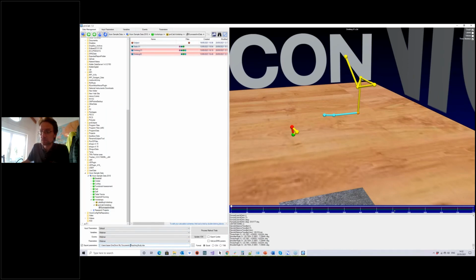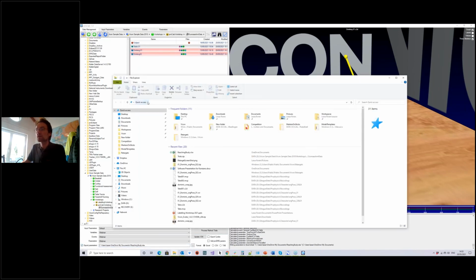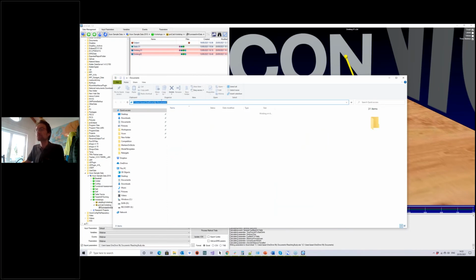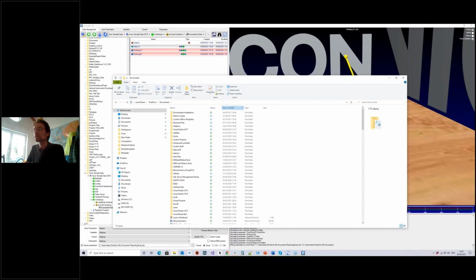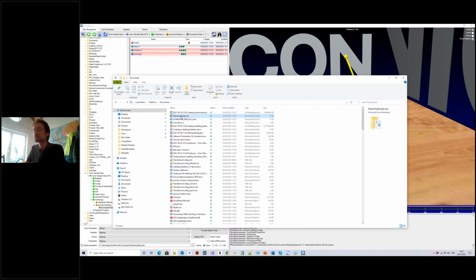So as you can see, I've got a reaching study XLS spreadsheet, and I've set it up so I know where it's going to end up. So if I open up this document, this is it.